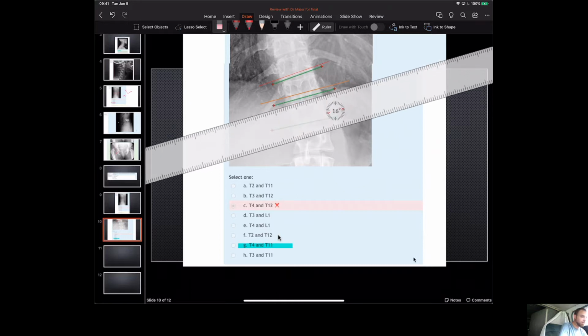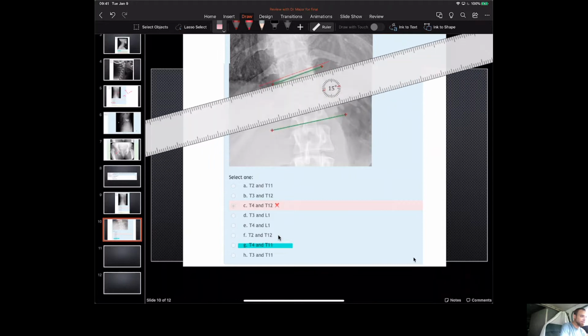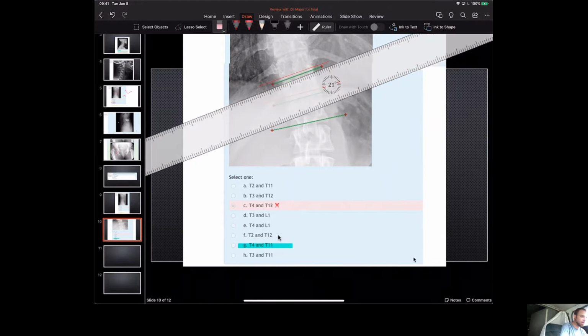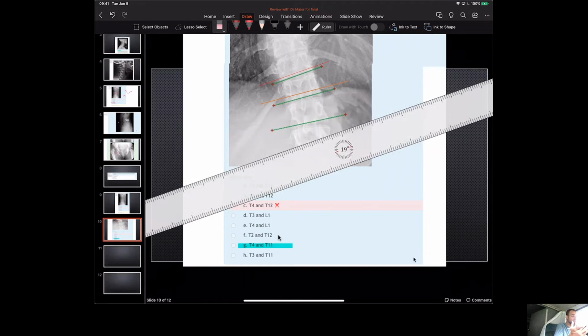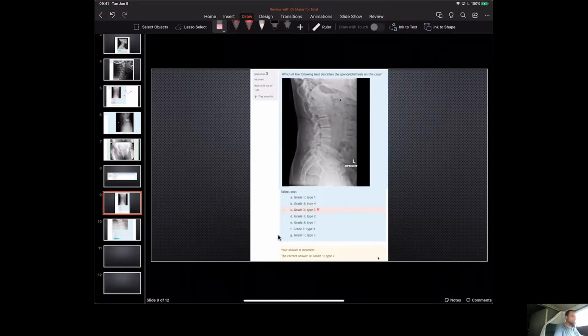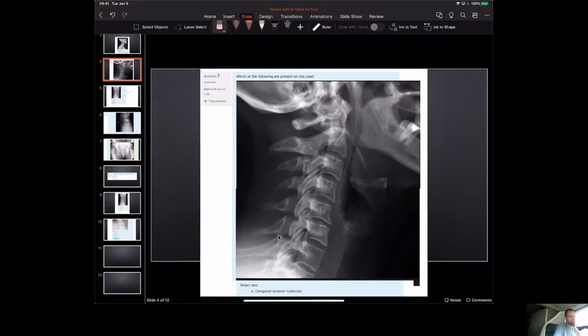It's free. Everybody at school has PowerPoint, and so this is basically like a generic DICOM viewer, right? I mean, you'd have to do the math. You'd have to set one angle and measure off the other, but the more important part is that you have this nice ruler that allows you to do the shift. And I just thought that's really awesome. And right in your hands, like everybody with a touch screen, at least that's what they say we're required to have, should have access to that. And as far as being able to pick something and zoom in and zoom out, I think it's just marvelous for that too. Right. So that's my share.